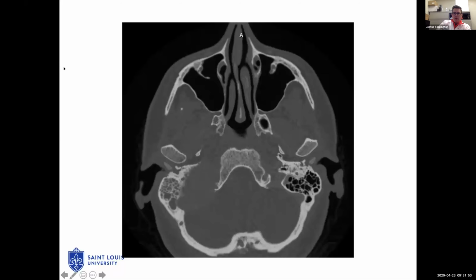To keep things moving here, this is a patient that comes in from their PCP because they had an ear infection, and they got the CAT scan, and the small town outside hospital read it as abnormal, recommend ENT. Didn't really put much else on the CAT scan. Anyone notice anything that looks a bit suspicious or a bit off or a bit odd?